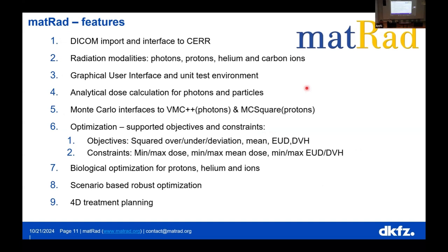Here's a little bit of features. So you can import DICOM images, you can run multiple modalities: photons, protons, carbon ions. In the next release that is coming, not the one we are using today, you could also do helium if you want to do it. And so on and so on.